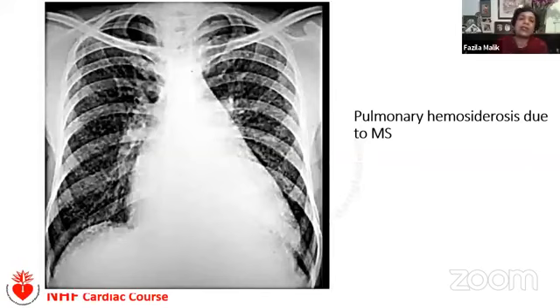Now, what happens if a patient goes on having alveolar hemorrhage? The iron is taken up by macrophages, and these macrophages are present in the alveoli, and with these iron-laden macrophages, eventually we end up with hemosiderosis. In hemosiderosis, it's a miliary mottling which appears in the lung fields. So if we get an X-ray during our exam, and if it's a third part MD exam, and you first of all notice the miliary mottling, look immediately to the borders of the heart. Is the border straightened?